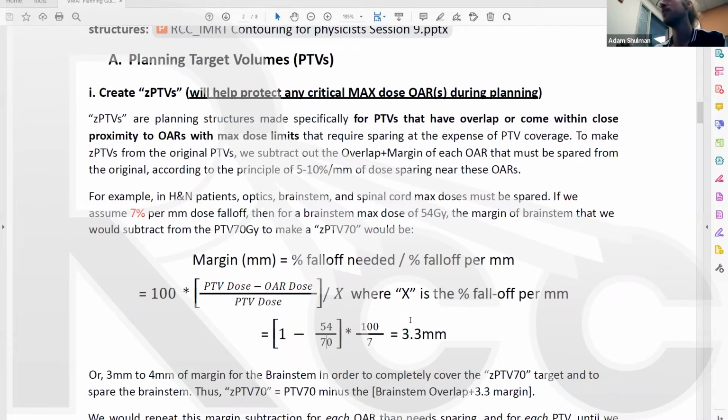Now you've guaranteed that you can get as good of organ at risk sparing as any other planner, and you can get as good or better than any other planner in the world at your PTV coverage. You've maximized those two. So it's really important to separate these contours. So now when you optimize, you're always looking at a sharp PTV, and that's important with maximum dose fall off.